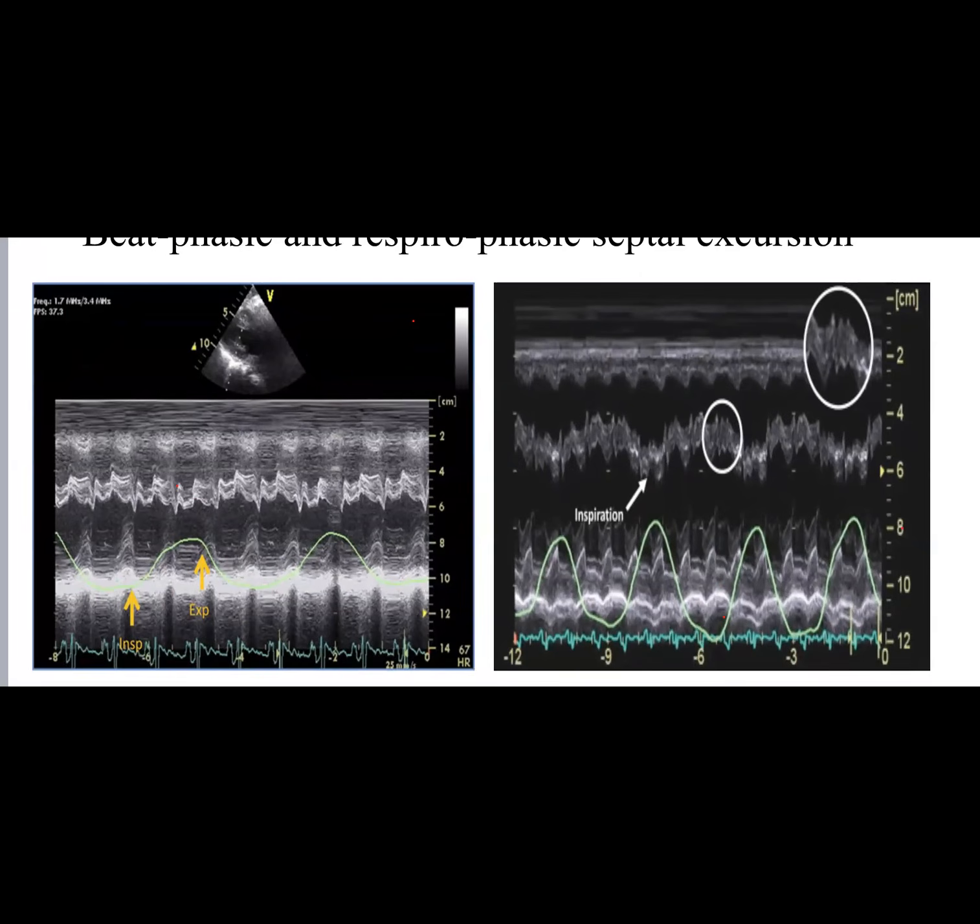IVC? No, this is not the IVC. This is the M mode of the septum, the interventricular septum. Septal bounce, exactly. Where is the septal bounce? On the left or on the right?